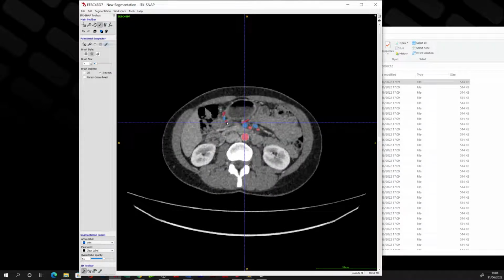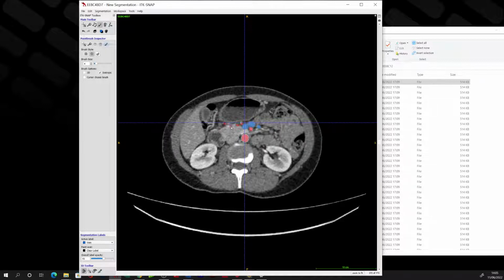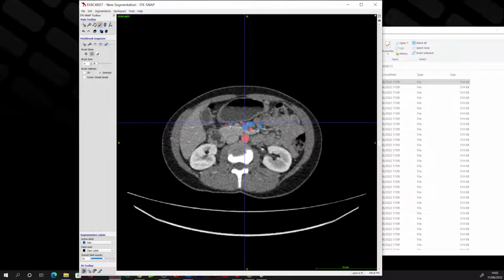You see, it does this hairpin turn, where it's running lateral and to the right before doing a hairpin turn, and then running medially to drain back into Henle's. That will be the classic thing you'll see for the GEV, and is a really useful means of helping identify that vessel when you're starting out.